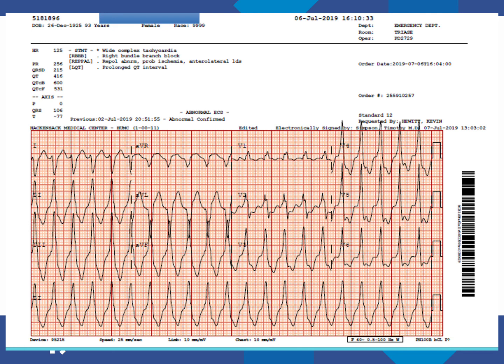So this is ventricular tachycardia. And it turns out that this patient deteriorated very quickly, fortunately in the resuscitation room with electrical pads on her chest. She came back to sinus rhythm with cardioversion. It's not always immediately obvious, so you need to learn to recognize the signs of ventricular tachycardia.